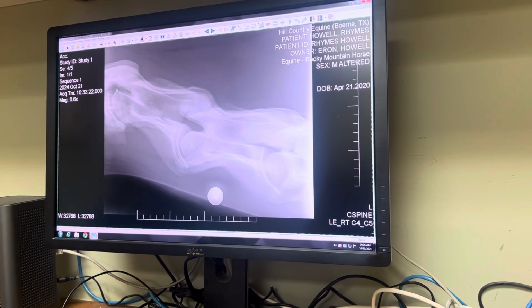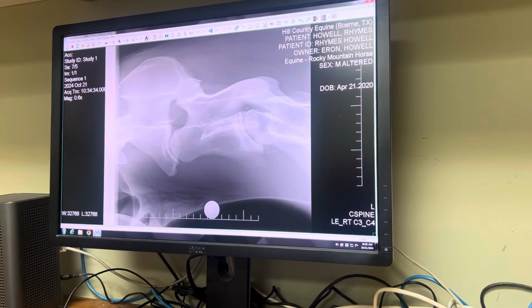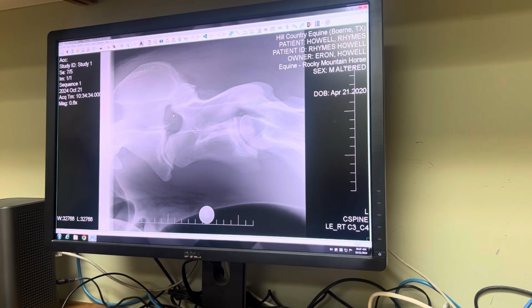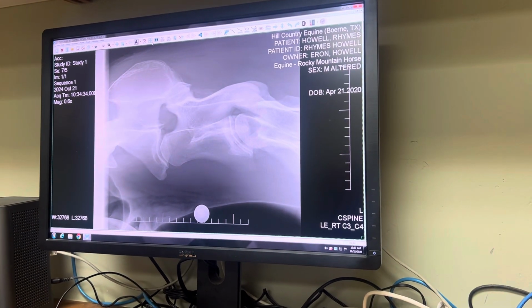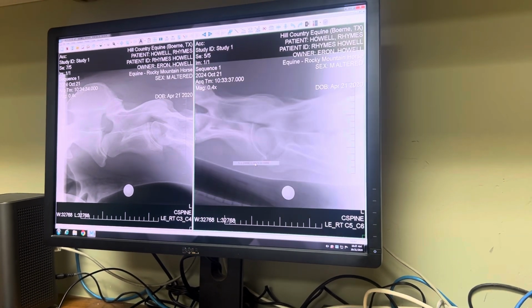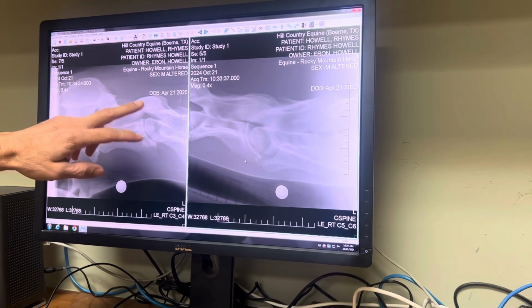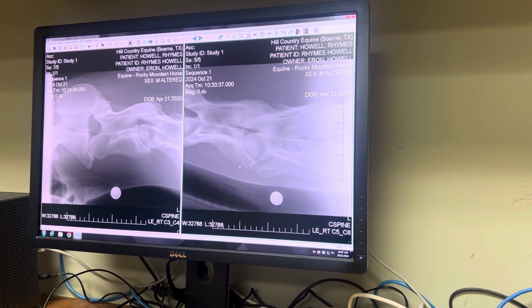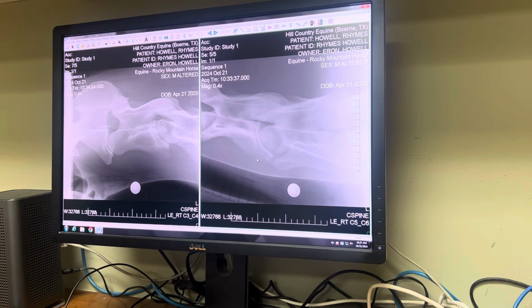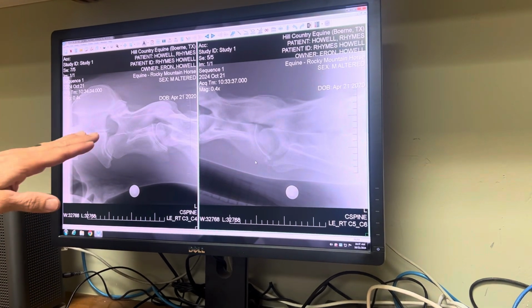This one's so bad that I'll fast forward you to the true radiograph. This is the radiograph that shows you how significant that really is. This is where you appreciate this sagittal ratio, meaning how open the spinal cord is, should be much larger than what it is back here, but you can see this one's crushed. There is no way you would go into a CT scan and not see spinal compression here or spinal cord compression here. So that's good for y'all. That's normal. This is what's abnormal.